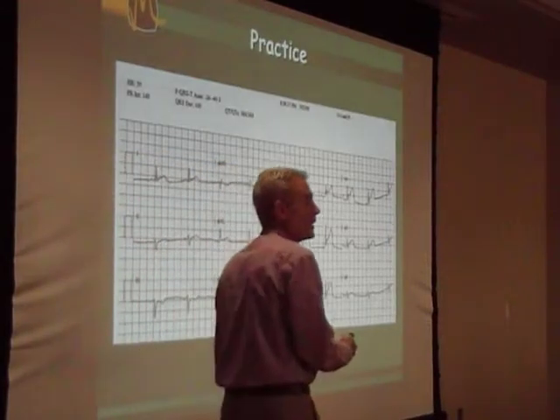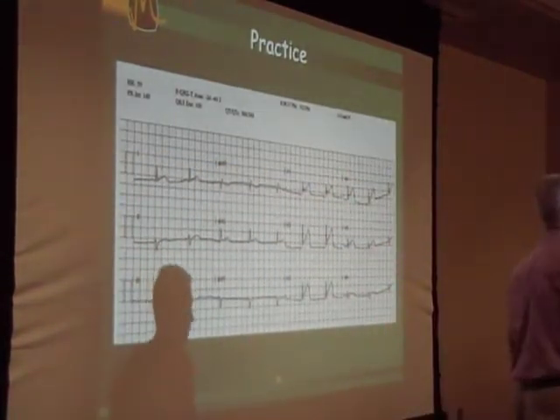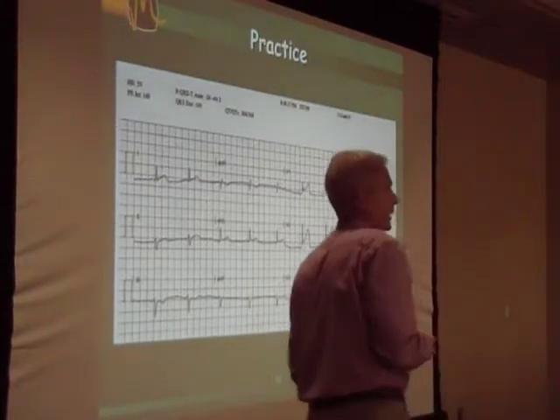So just a few more EKGs for practice. If you're on page 19, go ahead and take a look at that one.